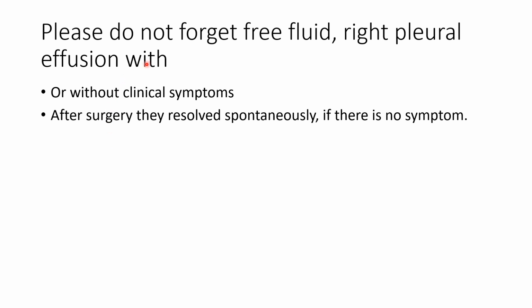Free fluid in the first days, pleural effusion, especially right pleural effusion, is small and without any clinical symptoms like dyspnea, tachypnea, or hypoxemia. It resolves spontaneously. So don't forget about the fluid, especially in the bare area of the liver. Please interrogate all parts of the liver.